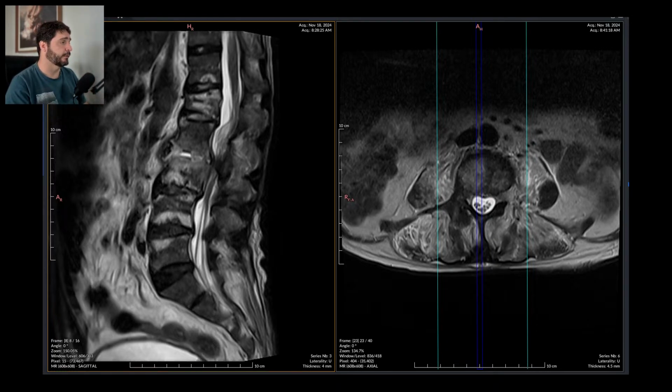And we are done. Thank God. Did I make it? Oh, it's without contrast enhancement, of course.